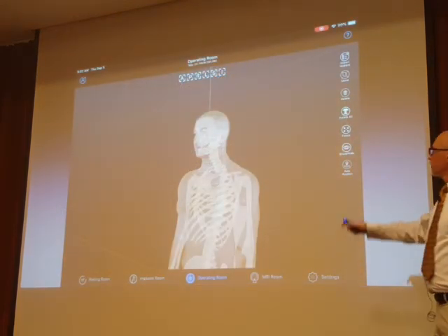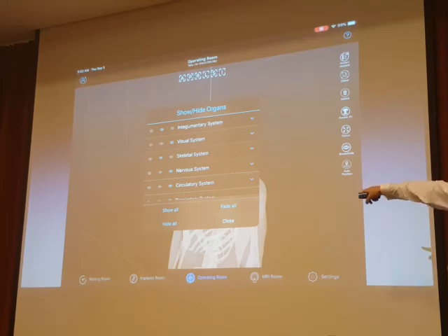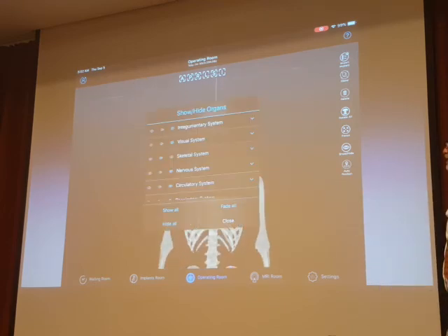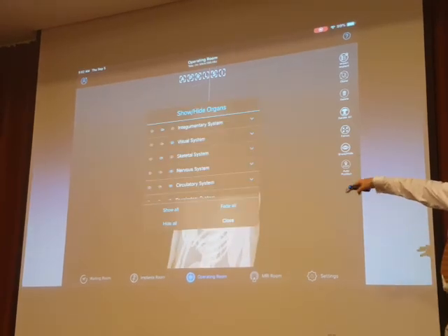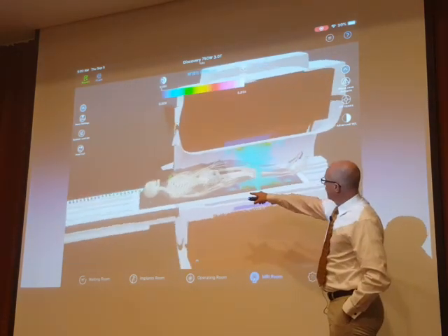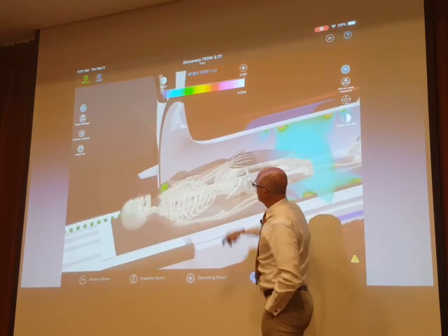So the deep brain stimulator. This is actually from magnet vision, the same thing that we showed, the magnetic fields. You can actually put implants in a patient. So I put a deep brain stimulator in this simulated patient. And you can turn it so that the individual organ groups and skin are semi-transparent or opaque. So inside here is the deep brain stimulator. And here I have the patient positioned for a knee study, and we're showing the radio frequency energy. And here are our hot spots.